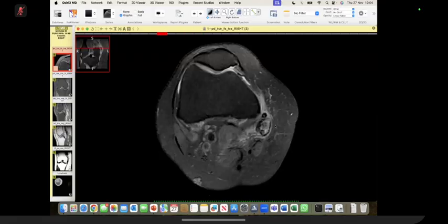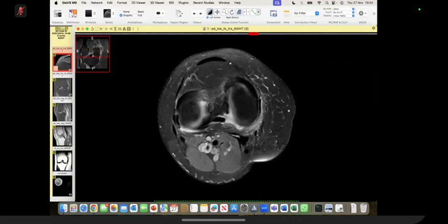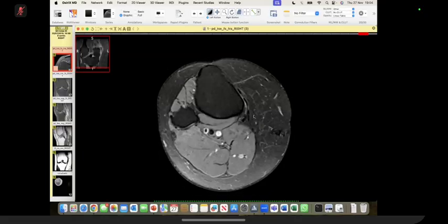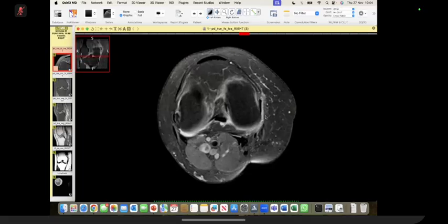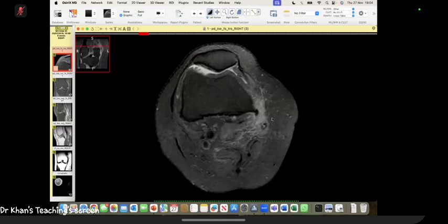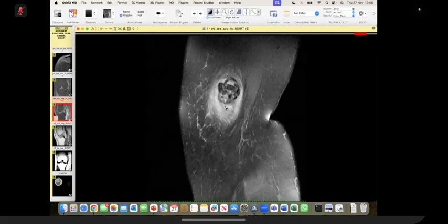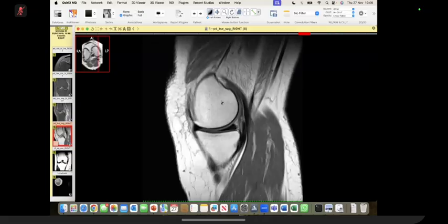And I showed you in a PowerPoint slide the various tendons. And so I have now gone more distally. This is fibula, this is tibia. And you can see these three tendons as I am coming up. You can see here, it is involving them. And if you want to confirm it, though I did not show it to you, here you can see the anatomical location.